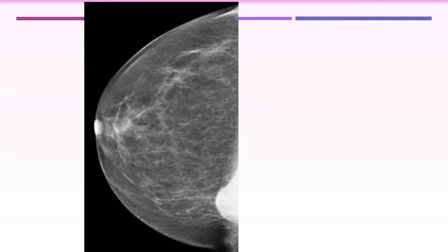So we have to do ultrasound. We don't expect these lesions, or we can look at the MLO view. If it is a mass, it might be visualized, but if it is not seen, it still could be a mass, because we said a lesion in the extreme medial breast might be out of the field on the MLO view. And the sternalis muscle is usually not visualized on the MLO view.